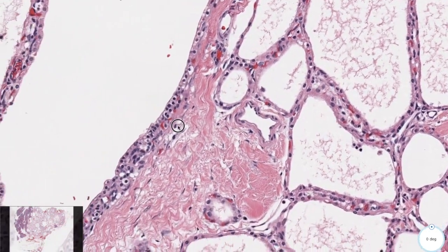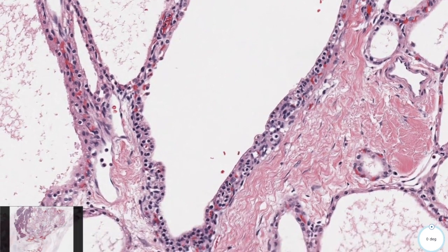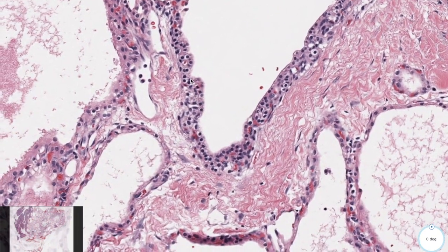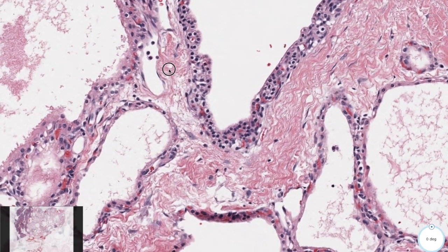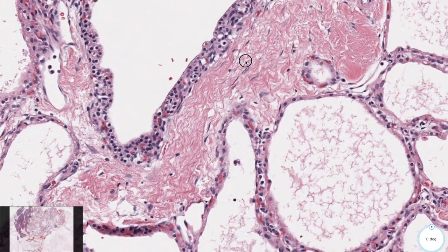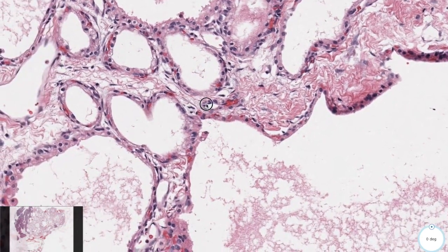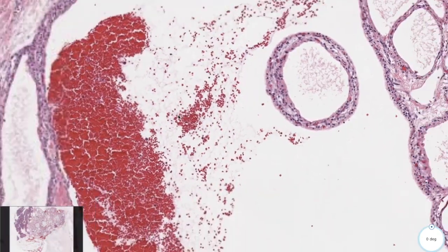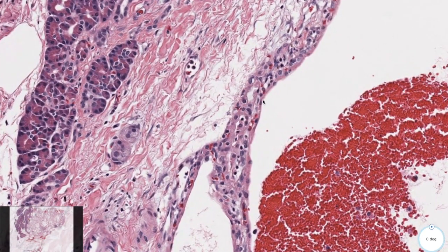But they look like very cleared cell lesion, very benign. The nuclei are very well organized. We're not seeing mitotic activity. We're not seeing high-grade nuclear features. We can even compare the sizes of these nuclei to maybe a lymphocyte, which will help us get a rough estimate of how big the nuclei are. Another good idea when we're looking at nuclear size: take a look at these cells lining the cyst and take a look at the nuclei of the benign normal pancreatic acini. They're roughly the same size.